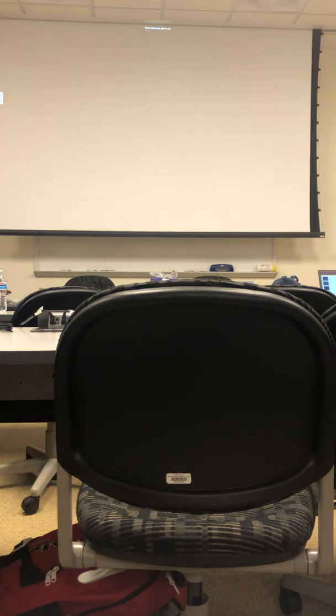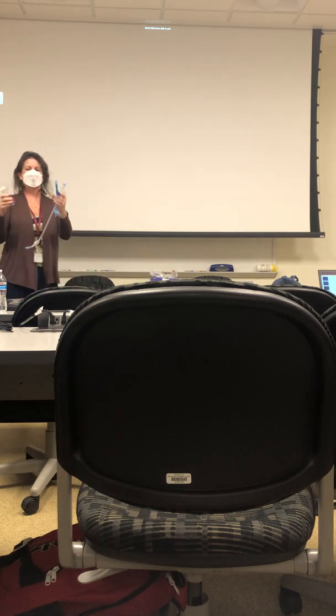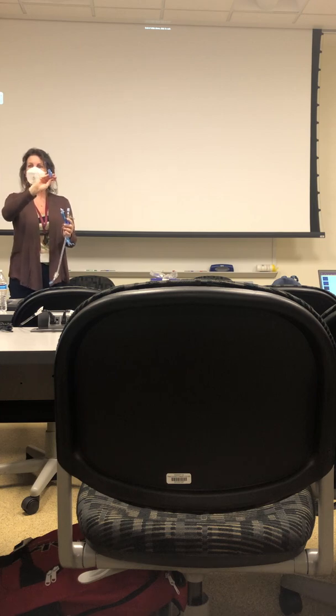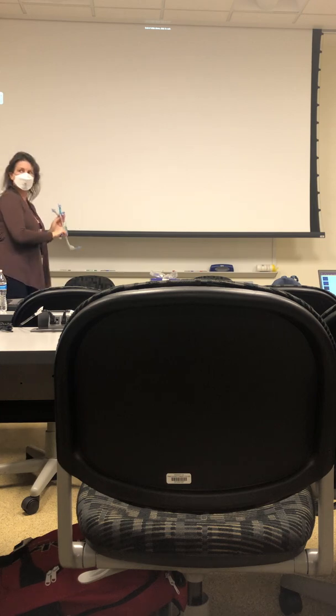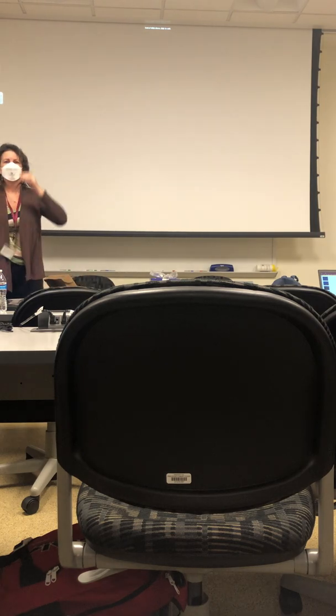Hey, I didn't tell you this: this is an adapter for your endobronchial tube here. You can actually hook these both up to this and ventilate with just one ventilator if you wanted to, okay? But I showed them, I handed it out. All right, guys? So it's 10:30.